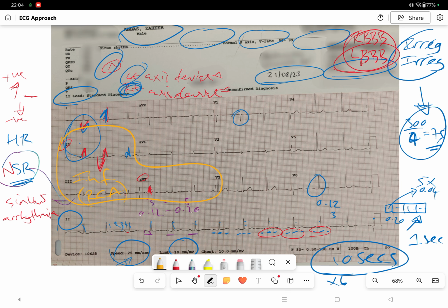The next bit you've got is this section here. Essentially, if you look at it, it is looking at you, so it's anterior. So it's kind of anterior, and that also is anterior, and then this is kind of septal. This area here is kind of a divider between this side of the ECG and this side of the ECG, i.e. a septum.